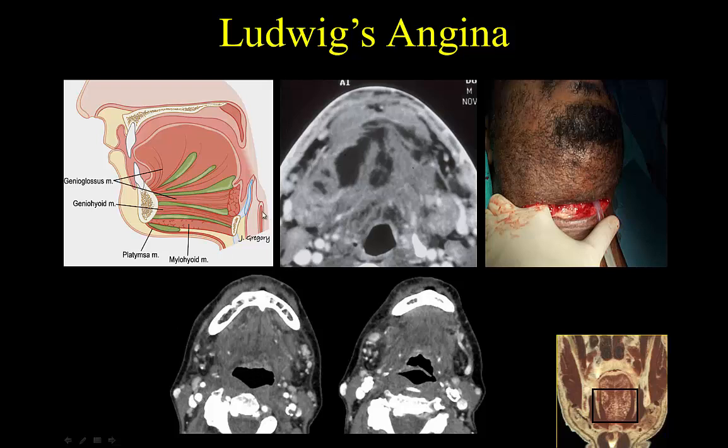Now radiologically, what we see in Ludwig's angina is essentially a compartment syndrome with multiple abscesses. So why does the patient get strangulation? Well, because these abscesses and inflammation cause the tongue to extend posterior superiorly, which compresses the airway. And if you look here, the epiglottis is actually swollen as well. So that's why the patients get this strangulation feeling. And somehow the cardiologists stole the term angina from us, but the original term was actually strangulation.